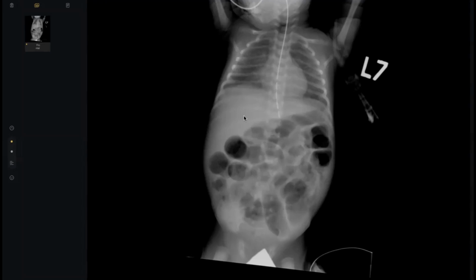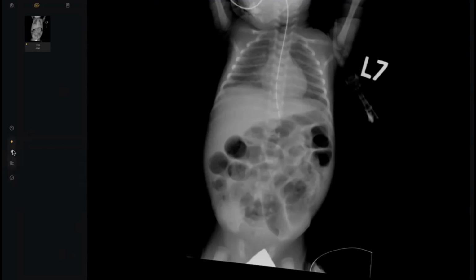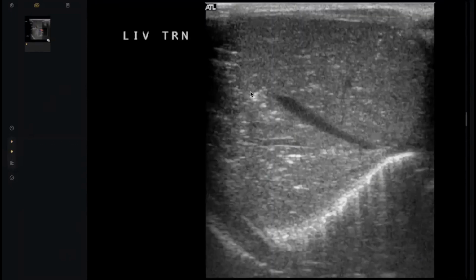Pneumoperitoneum, doctor. Very, very simple question. Okay, very simple. Pneumoperitoneum, because pneumoperitoneum is concerning for perforation. And why do I ask this question? Because portal vein gas in a neonate is not a dangerous sign, my colleague. Leave the mouse, please. Portal vein gas in a neonate has a not bad prognosis. The opposite in adults, portal vein gas is a dangerous sign. That is why I ask him.